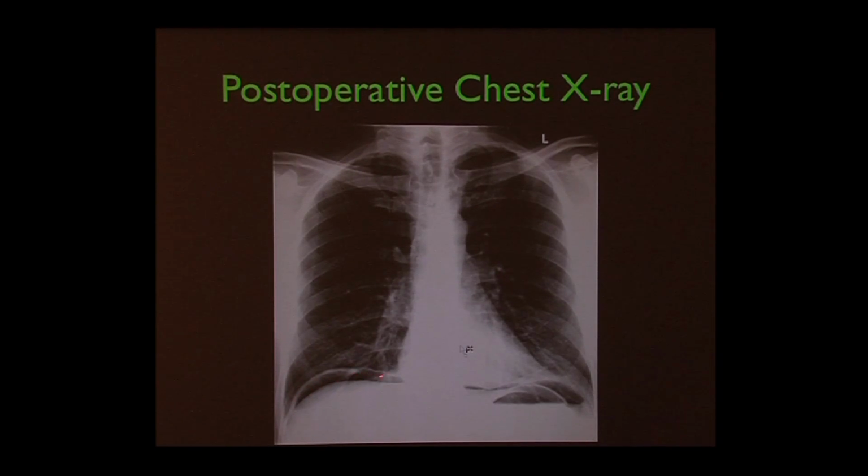Well, something else rose up here. These are the diaphragms. So this separates the abdomen from the chest, and that shouldn't be there. So that's gas in the abdomen. Now, this patient had a reason for it. She had recent abdominal surgery. So there's always some gas in there after they've opened the abdomen. But if it wasn't that history, let's say it was possible bowel obstruction, that would mean the patient perforated and air was leaking out of the bowel. That is a medical emergency, if that was the history. It wasn't in this patient.